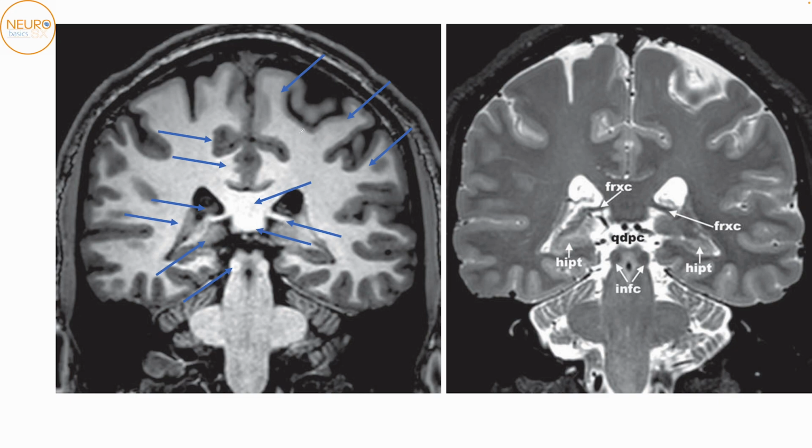Okay, so again, the more posterior you go, just remember the most basic anatomy, and that will help you figure out what are the different structures. The superior, middle, frontal gyrus. At this level, most likely the inferior frontal gyrus has ended at the level of the atrium, and you're going to be picking up on the precentral and the postcentral gyrus on the other hand instead. This is a cingulate gyrus over here, and this here is still the hippocampal formation. This is the hippocampal tail over here.